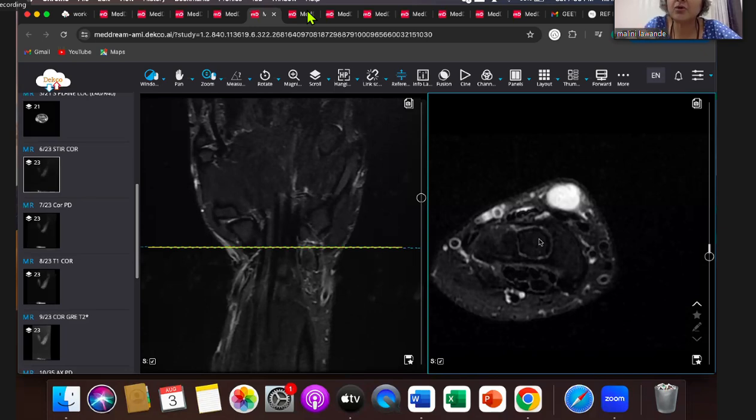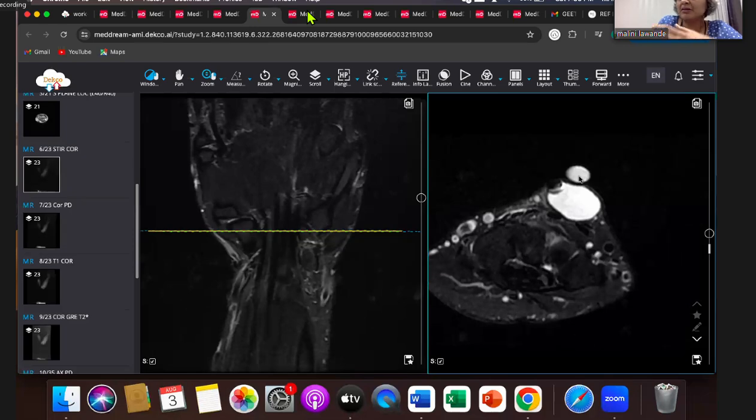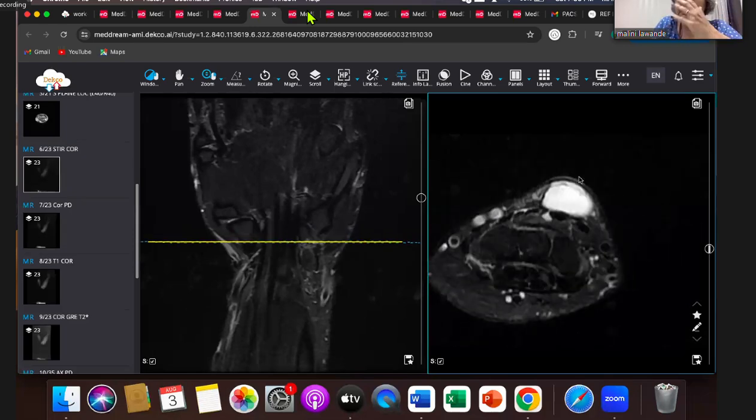It can be really small, a 2 to 3 millimeter lesion, but still could be causing a lot of pain. At the same time, you may have these ganglia asymptomatic. So many times you're doing a wrist scan, the patient has some TFCC injury or extensor carpi ulnaris tendinosis, and then there are these dorsal scapholunate interval ganglia. That's why it's important to put a pain marker so that you know whether that is the cause of pain or not. Here, clearly, the pain marker is right overlying the swelling and the swelling is seen.